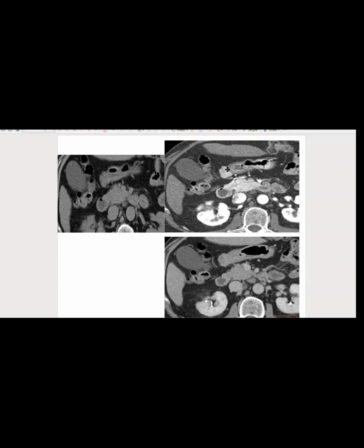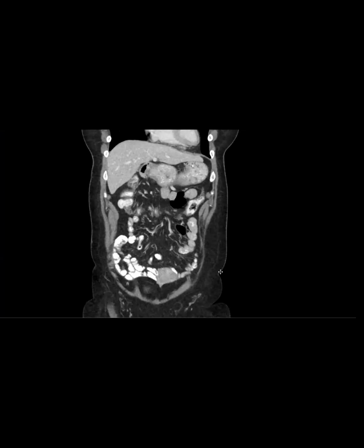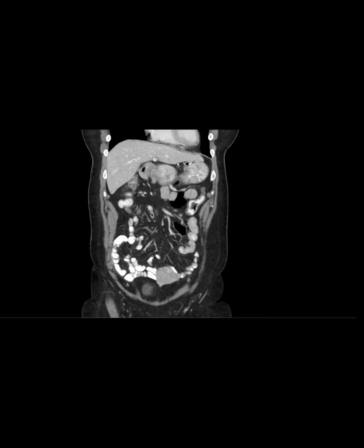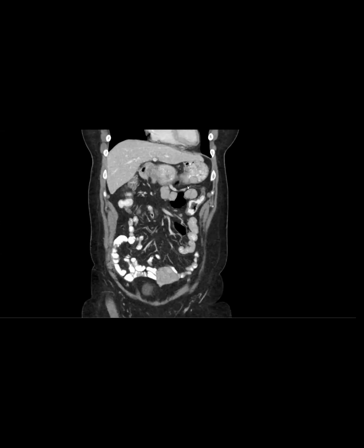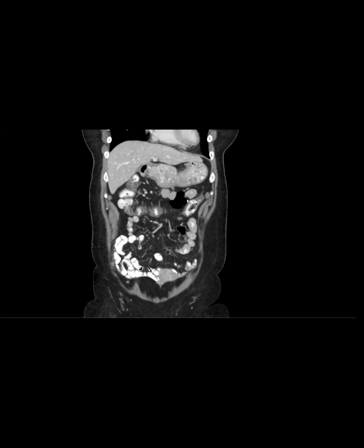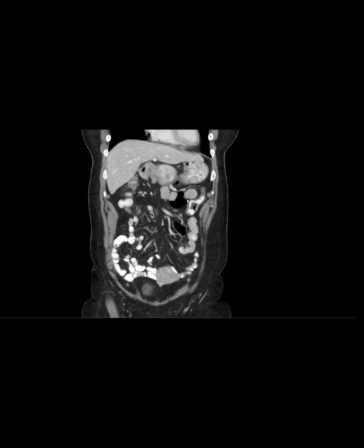Nice. I feel like the second case looks nicely like the pancreas, fluffy and enhancing, but that first case almost looked more like a mass, like it didn't have a lobulated border as much. Yeah, I agree. We didn't even mention that in our differential when we first read the CT. It was only after endoscopy that they got some tissue, and then I think it would be really hard to call this prospectively. Yeah, definitely. Cool, thanks.